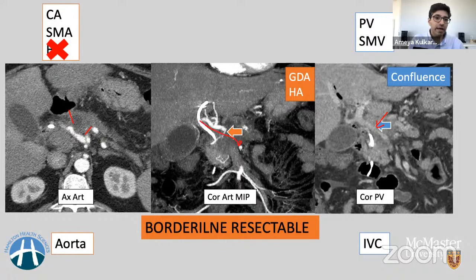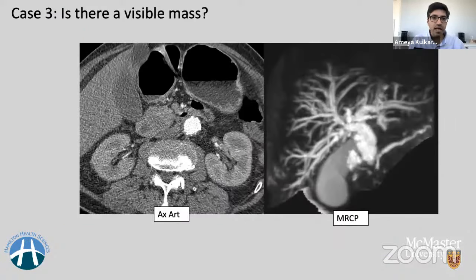In that case, even if the hepatic artery is in close contact with this tumor here, there will be a replaced right hepatic artery which is coming from somewhere over here, which has no disease at all. That totally changes the level of confidence of the surgeons when they are going to perform surgeries in this patient, because now the vascular supply to the liver is not going to be compromised because of this replaced right hepatic artery. So always look for those vascular variants.